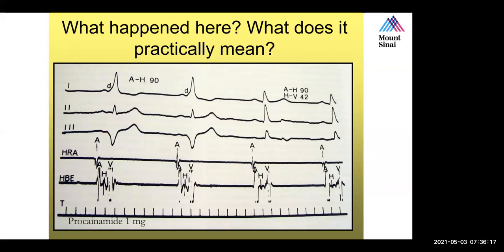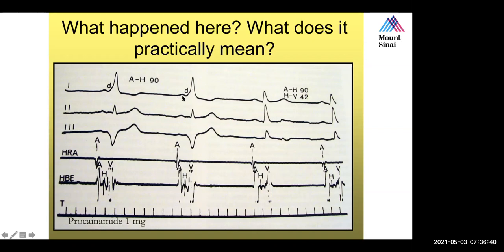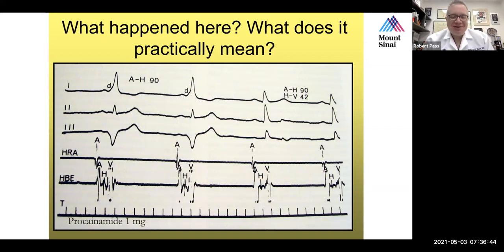I guess the biggest changes we see are in lead 1 and the surface leads, where we had maybe a delta wave that's a little bit more narrow now. Yeah, I think this D, I stole this tracing, but I think this D is meant to denote delta. I should have seen that too. I didn't actually see that till now myself. So we're both guilty of not paying enough attention.